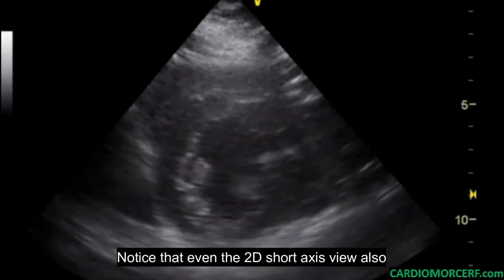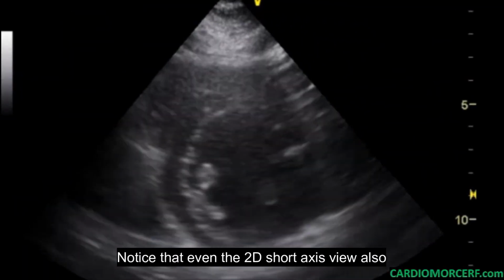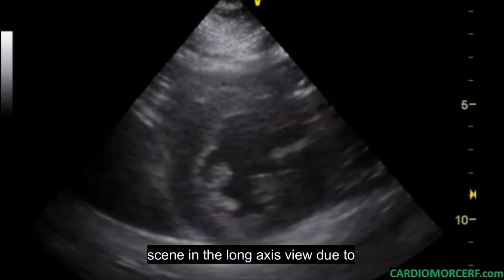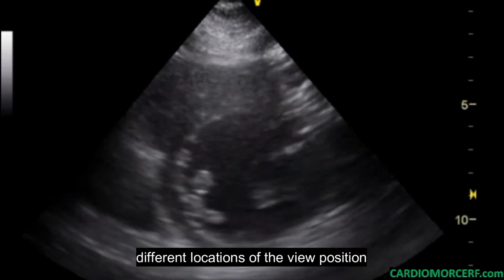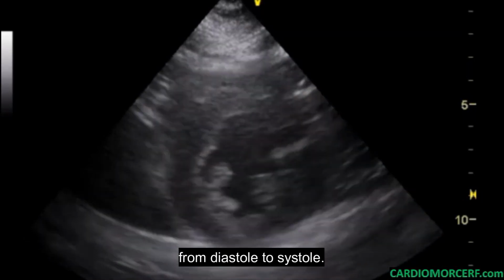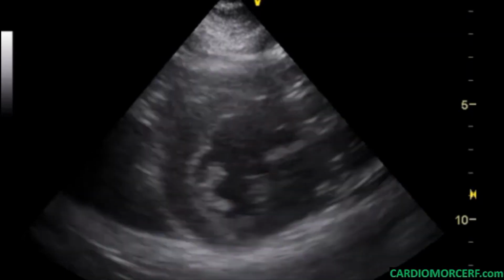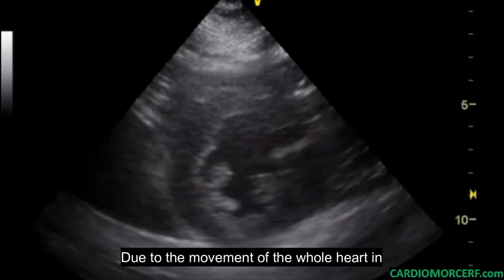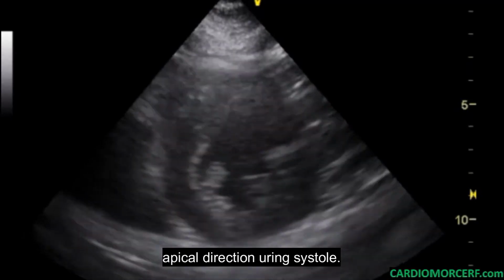Notice that even the 2D short axis view also demonstrates a better function than one seen in the long axis view due to different locations of the view position from diastole to systole, due to the movement of the whole heart in apical direction during systole.